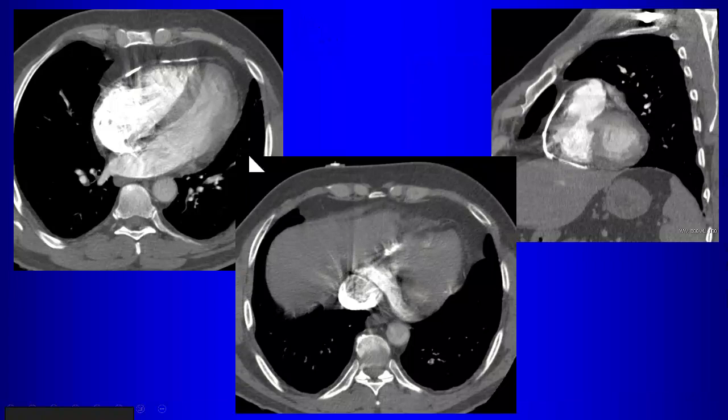And then on CT, we can see it a little bit easier. So here's the pericardial calcification there, okay? And then here it is on this reformatted short axis view. On the lateral view, you can see it's usually easier seen more anteriorly. So in this particular patient, do you think this pericardial calcification is physiologically significant? Yes or no? Yes. Why?